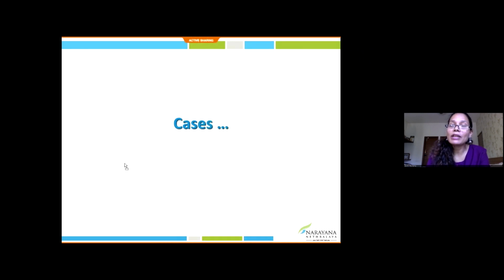So let me now try to explain with cases. Since it's not interactive, I would like you all to think in the same way and try to be at the same level, so you will also be able to reach the diagnosis. Again, six important questions, and I'll repeat them so that they get fixed in your mind, so that whenever you look at fields next time, you know how to apply.